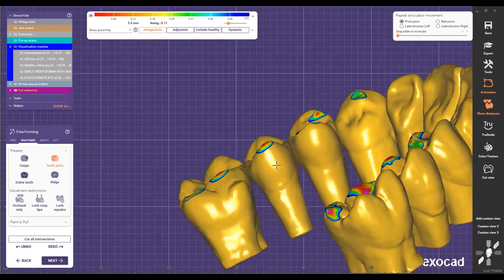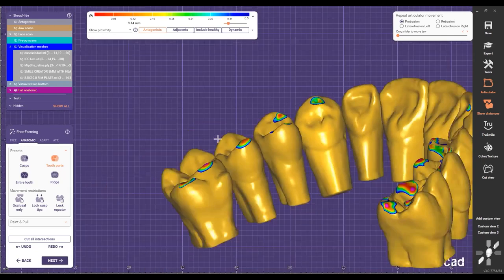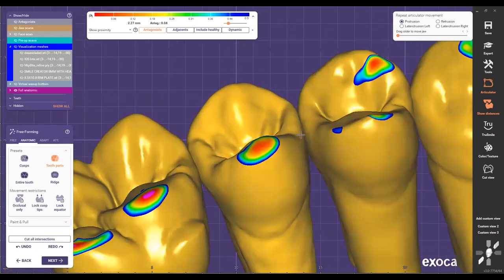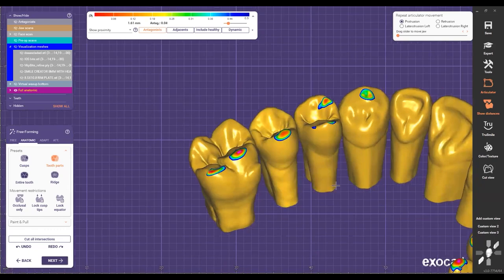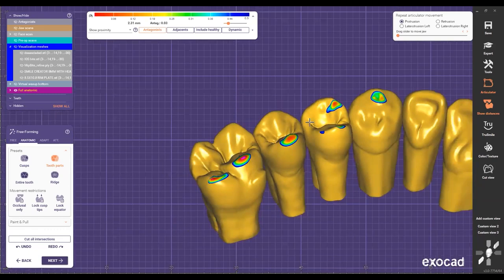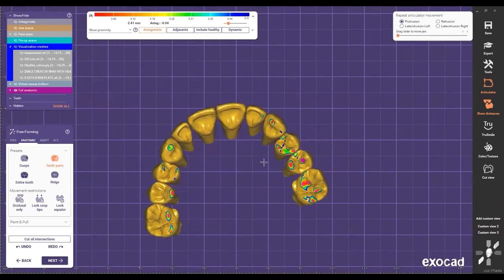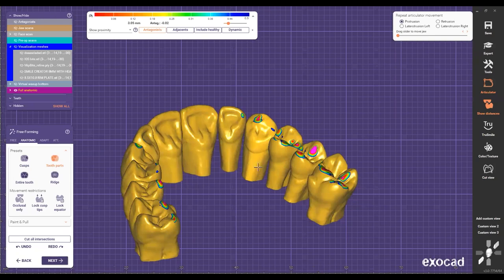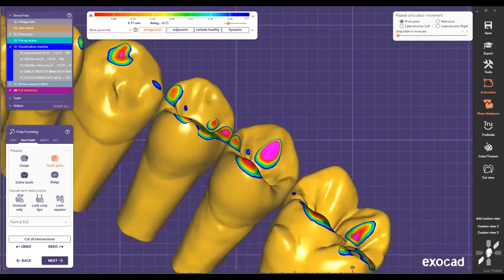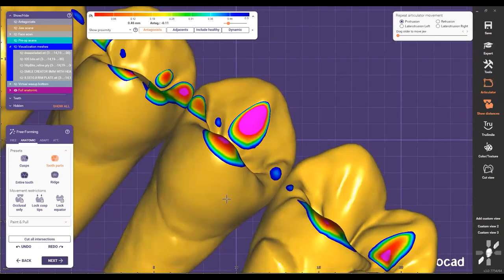And also, one of the things that I check is the height of the ridges, the mesial and distal ridges, to make sure that they're even, right? You don't want to leave one ridge higher than the other one. So there's a lot to know once you start doing these cases, right? But it's fun once you understand those things. You're gonna have a good eye on how to handle these cases and get it done the proper way. So you guys can start doing these cases by following those little details, right?